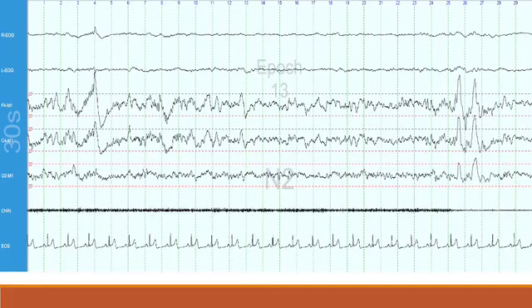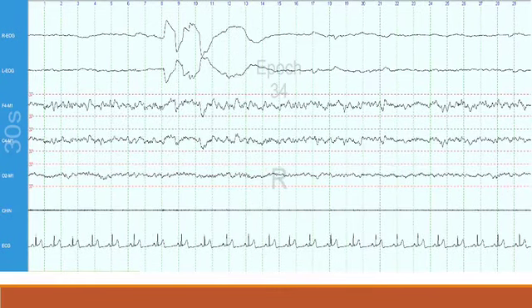So here's an example of stage 2. Again, you see something very significant right here. You see a chin drop. And because the majority of the epoch is still stage 2, low amplitude mixed frequency, possible K complex or something like that, then certainly this favors stage 2, even though you had a drop. And then, of course, now we go into stage R, because we have definite R here.